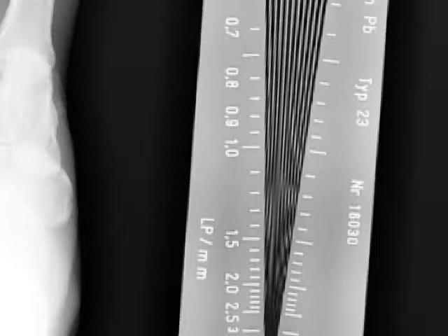Do you see that kind of funny magic eye, these folds here? Like there's a fold, there's a fold, there's a fold. You see those little things? Those don't really exist. That's an artifact. That's not there on the object.